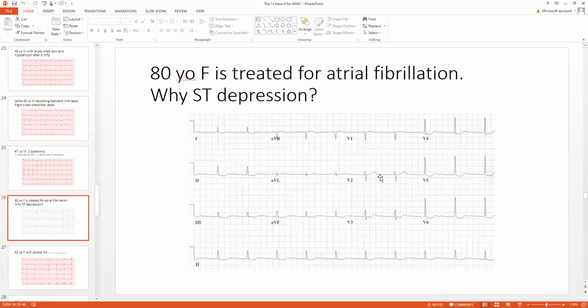And you shouldn't think it's digitalis intoxication either, because the electrocardiogram of digitalis toxicity is increase in automaticity of the atrium, which you don't see. The ventricle, ventricular ectopy, you don't see. Sometimes you get AV block. You don't see that. And you can ask the patient, are you nauseated? How's your appetite? Do you have a bellyache? Do you have funny vision? And if all those are negative, you can forego the blood test. But if you're concerned, you can draw a digoxin level.